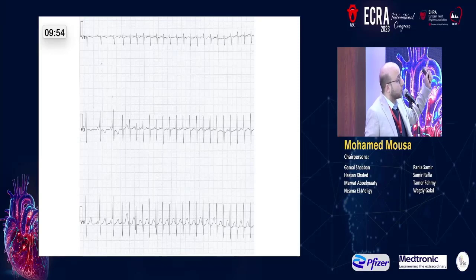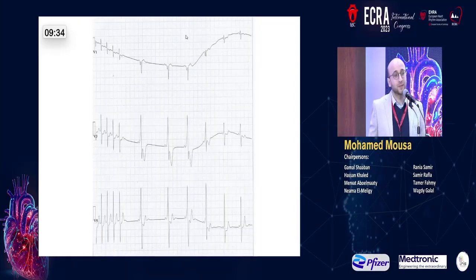If this is accessory pathway, then this is AVRT. What about V1? This P wave is actually on top of the T wave, but it can be a short RP tachycardia, longer than 100 milliseconds, so it's going with the orthodromic tachycardia. Common is common: accessory pathway, AVRT.